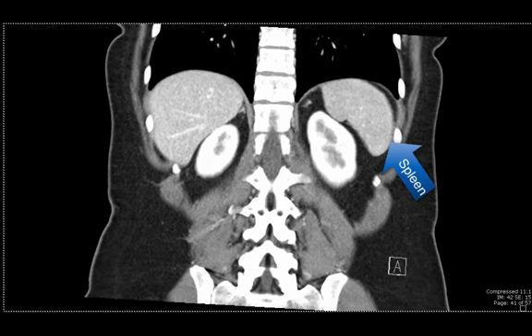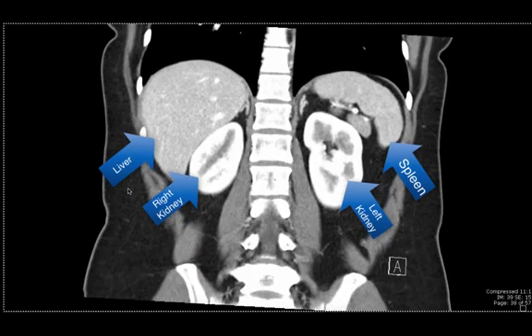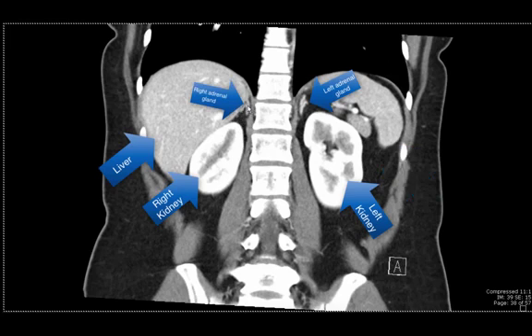You can see its craniocaudal extent in this plane very nicely. Adjacent to it on this image, you can see the left kidney, and on the other side of the spine, you can see a portion of the right kidney as well as the liver that lives right above the kidney over here. As we scroll through these images, we can start to see the adrenal glands also coming into the picture, this triangular shaped structure that lives on top of the left kidney on the left side and on top of the right kidney on the right side over here.